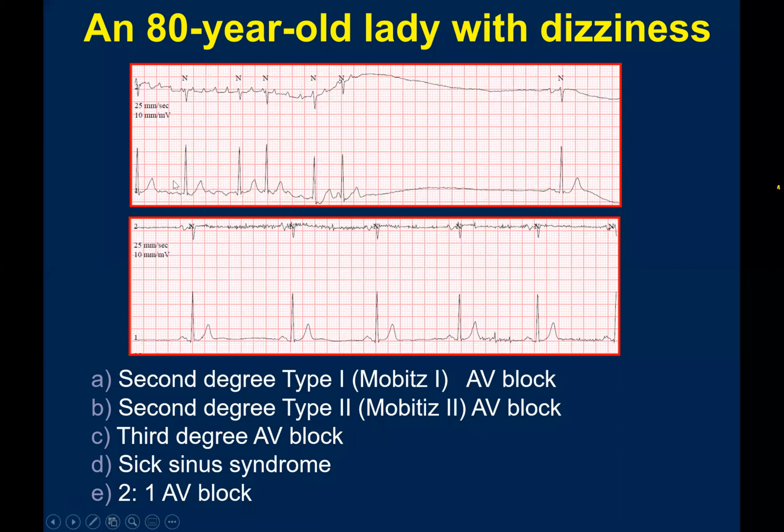So the patient is irregular here, AFib. One may argue because it looks like flutter in this lead, but we have only 2 leads. So if you say it's flutter with variable conduction or atrial fibrillation with variable conduction, both will be okay. But it's more of fibrillation.